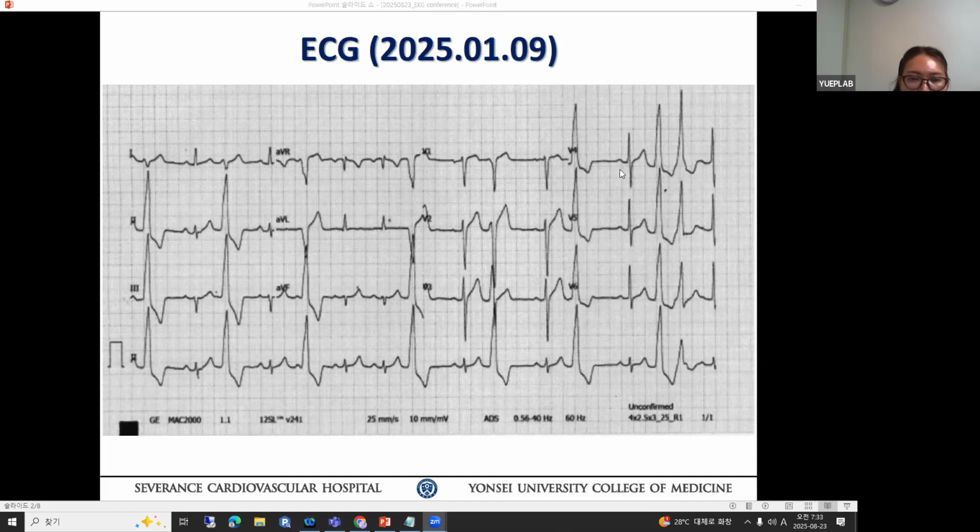RVOT anterior, yes. Septal side or free side? Septal side. Okay, and what else? Why the septal side? What makes you say septal side? What is the EKG characteristic of septal side? aVF upward. Lead one, aVL negative. Okay. And what else?